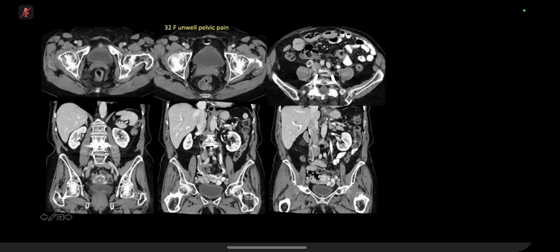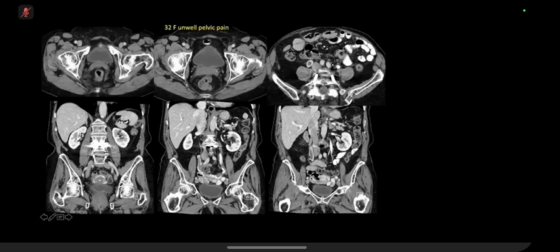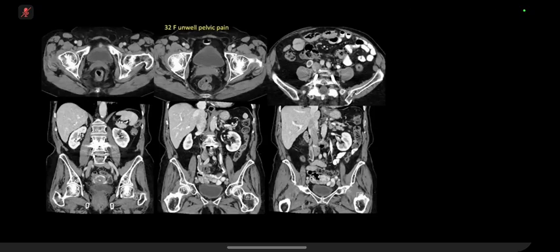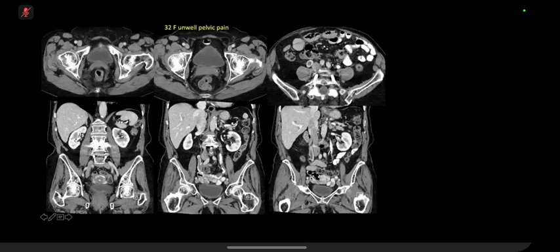Good. So what's the diagnosis? Yeah, so it's right ovarian vein thrombosis. Why? What is the cause? I'm searching for the abnormalities in the pelvis. I can see fat stranding in this image and the one below in the pelvis. Good. So yes, and maybe we can say there is mild thickening of the uterosacral ligaments. So there is fat stranding.